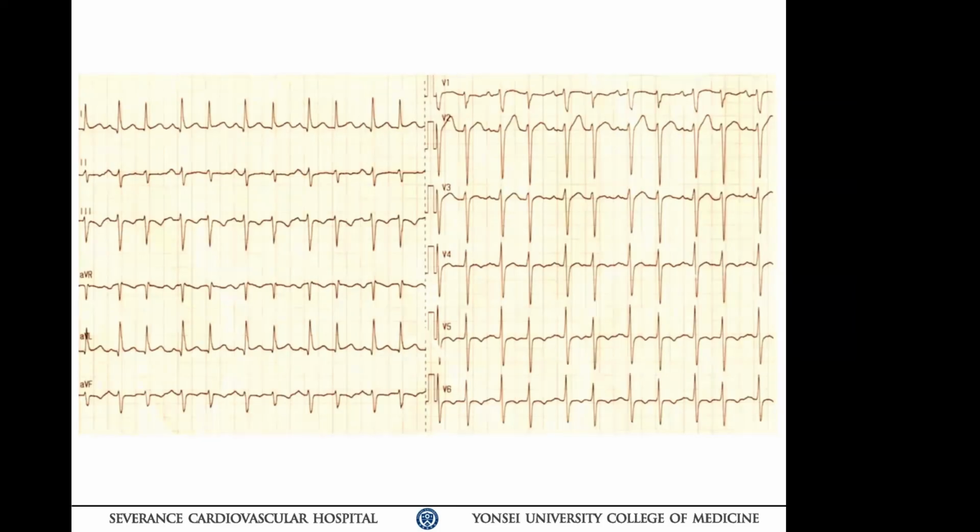So an additional diagnosis would be maybe fascicular bigeminy going on, sinus rhythm with fascicular bigeminy. That's the differential diagnosis. You have to put it in here. Okay?